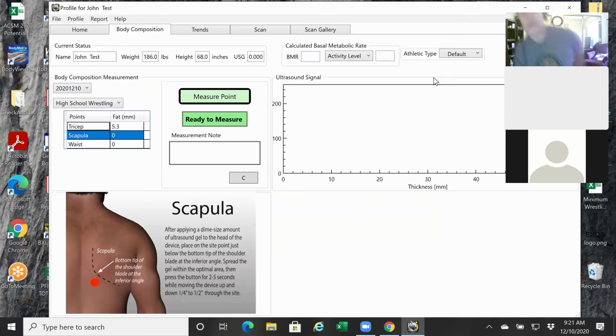And it's going to always ask you for a minimum of 2 measurements. In a typical scenario, if your technique is good, it will ask for 2 and then automatically kick you into the next site that you measure. Don't panic, guys, if it asks for more than 2. What ends up happening in that case is it kicks out the incongruent reading and takes the average of the 2 closest ones, provided they're really close, okay? So it's essentially a repeat of the same protocol.